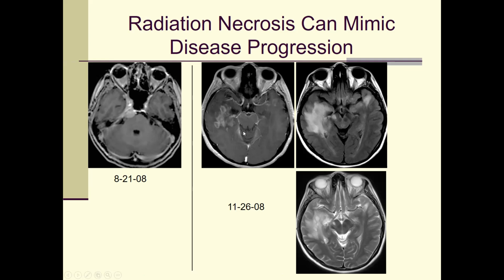But this is a patient who had a history of meningioma, which is an extra-axial mass, not an intraparenchymal mass. The patient had nothing in the brain tissue, but outside the brain tissue he had this dural-based mass, which was irradiated. So the radiation therapy was done on this tumor, and this temporal area can be in the radiation field. So this is eventually the radiation necrosis of the irradiated tissue. That's the radiation effect.